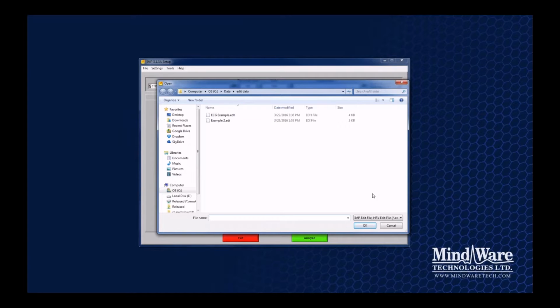We just can't handle the fact that there's noise in the middle of our segment. But in impedance, we'd want to mark those R peaks because we're actually losing information by taking that brute force editing technique that you have to apply in HRV. So while it is possible to reuse those edited data between the two types of analysis, just be cautious of it because there are different rules that apply.